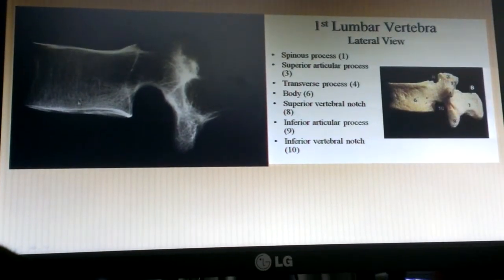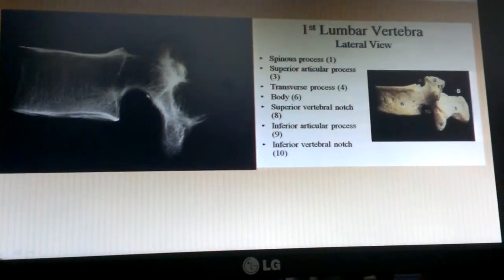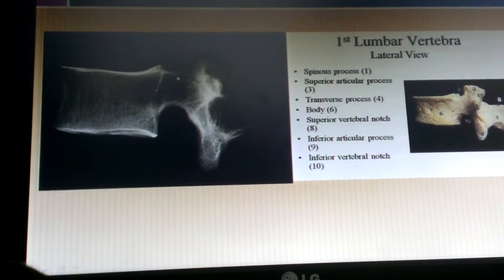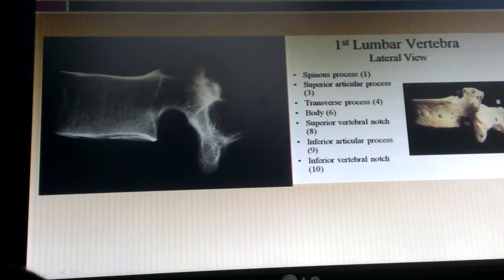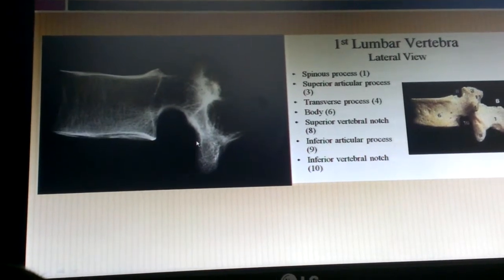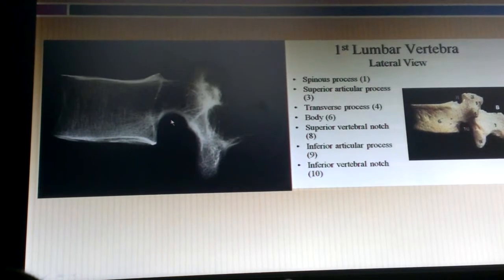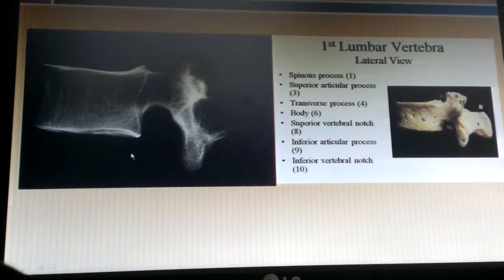So this is what we're looking at, right? Again, just like in the thoracic spine, the roof of your IVF or neural foramen is going to be the inferior aspect of the pedicle of the vertebra above, and of course the floor of your IVF will be the pedicle of the vertebral body below. And then the articulations here and here, right? And you can see how, with hypertrophic changes off of articulations, it could run amok with the IVF and all the components that are in there, right?